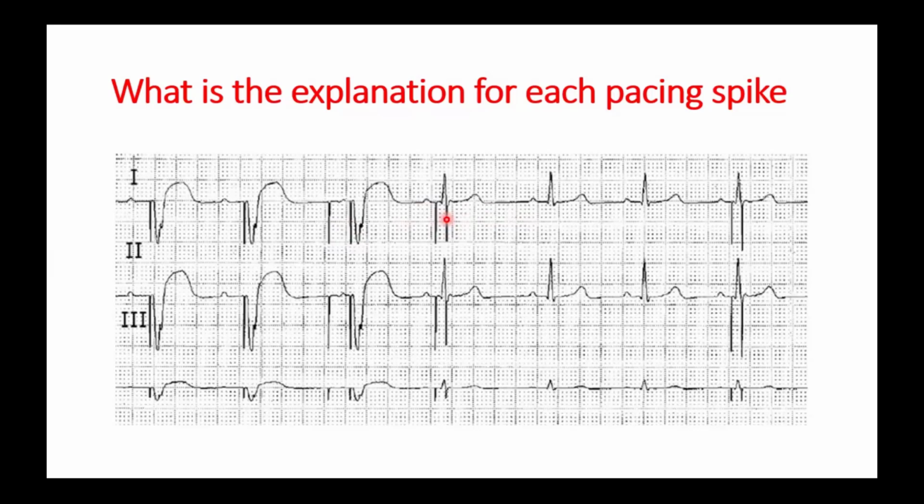This is ventricular safety pacing. The atrial pacing occurs, and incidentally, an intrinsic ventricular sensing occurs. So to prevent ventricular crosstalk, ventricular safety pacing is done. However, no capture occurs as the ventricle is already depolarized.